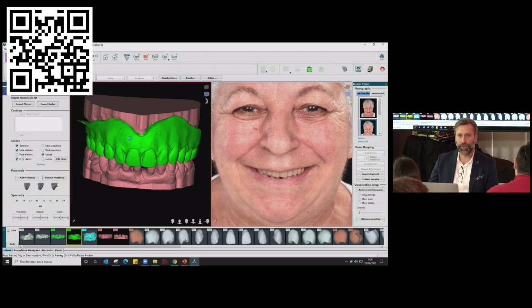And we can even use this as the soft tissue, because many times to scan a full edentulous arch with an intraoral scanner is not very easy, right? So relining the denture is like making an anatomical impression. That's what we usually do. Okay, that's what we did for her.